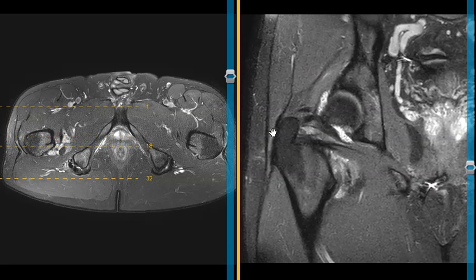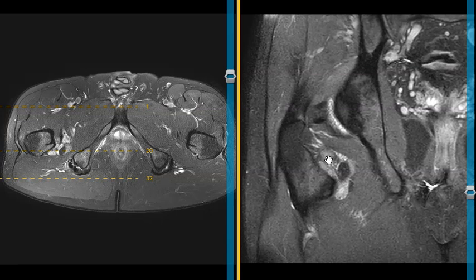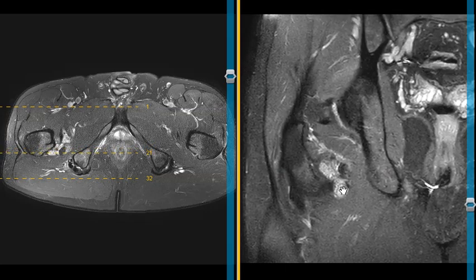But there's another bony protuberance down lower and medial. This is the lesser trochanter, and the patient has some really unusual signal over here. We see this dark band or glob. Here's another dark glob. We see this area of brightness and these areas of darkness in the middle, and it looks sort of nodular and strange. So this is really prominent synovitis within a bursa.